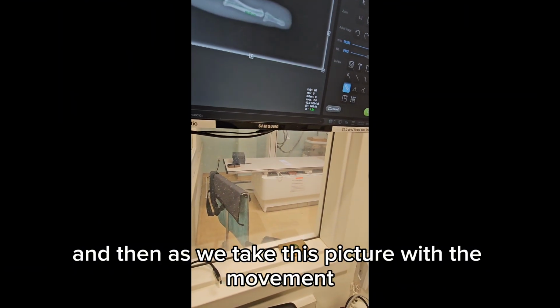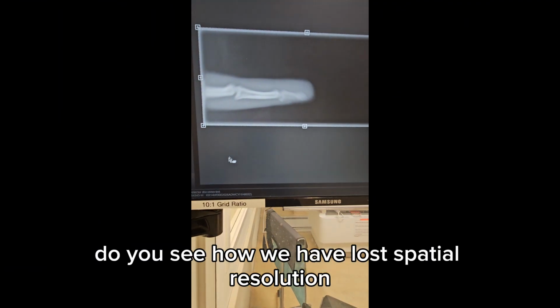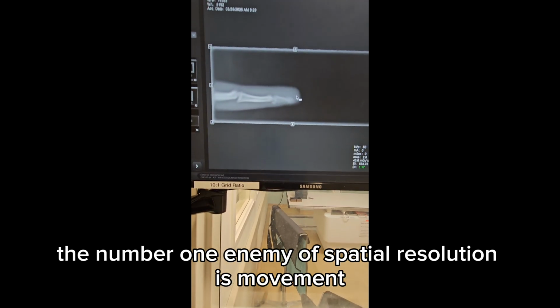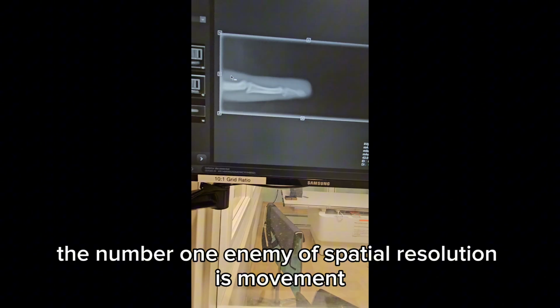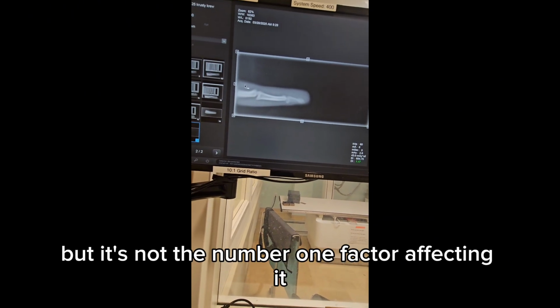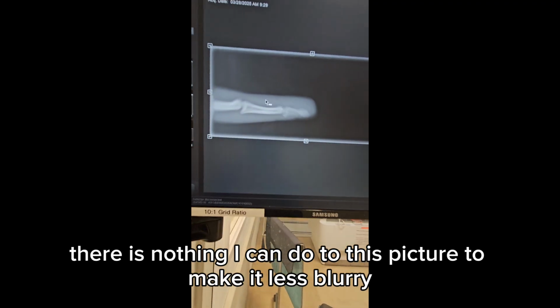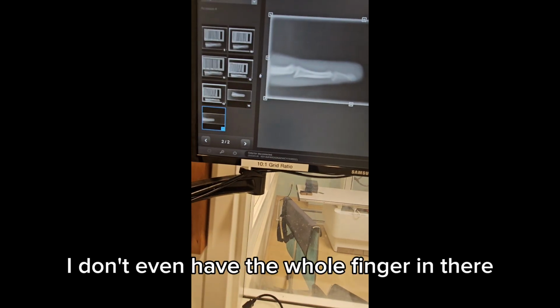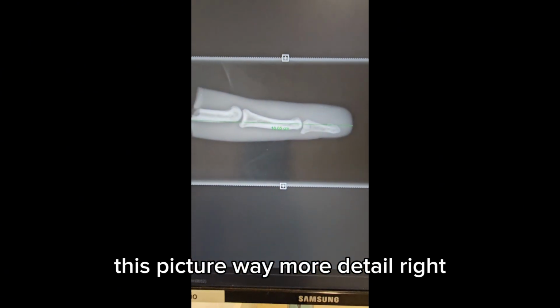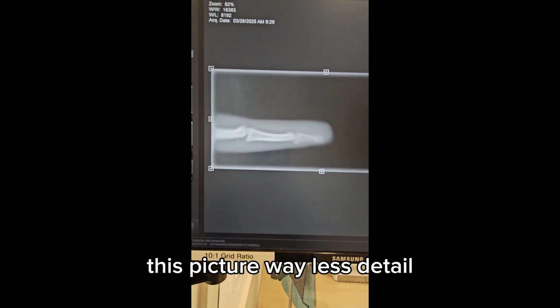And then as we take this picture with the movement, do you see how we have lost spatial resolution? We have movement. The #1 enemy of spatial resolution is movement. Focal spot size only affects spatial resolution, but it's not the #1 factor affecting it. There is nothing I can do to this picture to make it less blurry. I don't even have the whole finger in there, but that's okay. This picture, way more detail, right? Because I don't have movement. This picture, way less detail because I have movement.